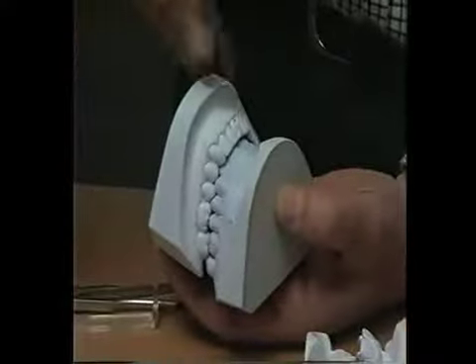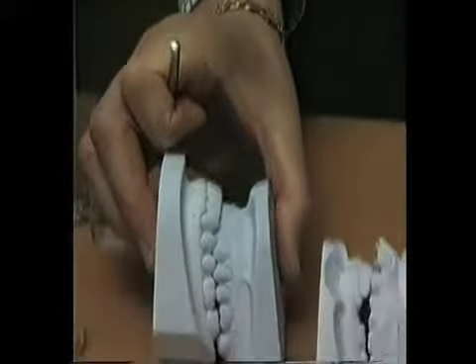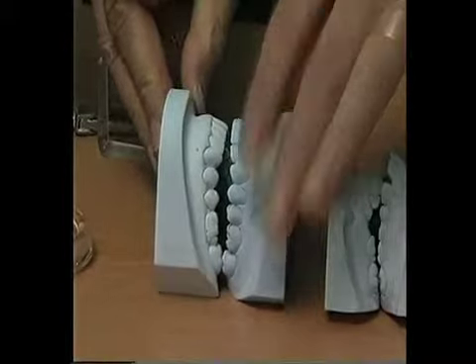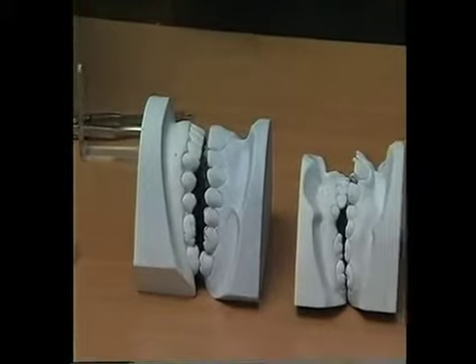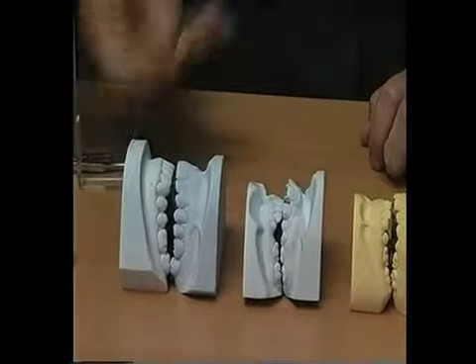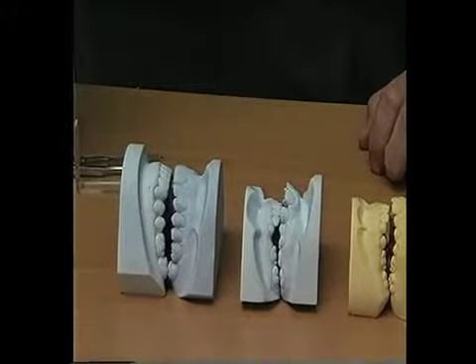The last models we looked at are third-class models. Here we have an important negative overjet. But we can also see how those models, once they have been positioned, reposition themselves in the space with a backwards movement on the level of the mandible.